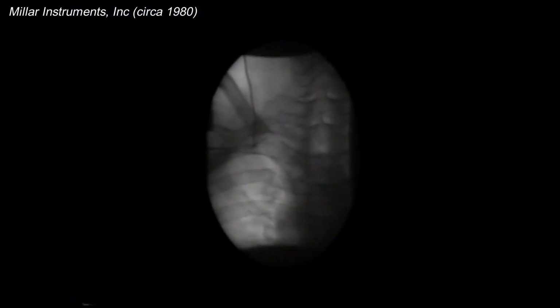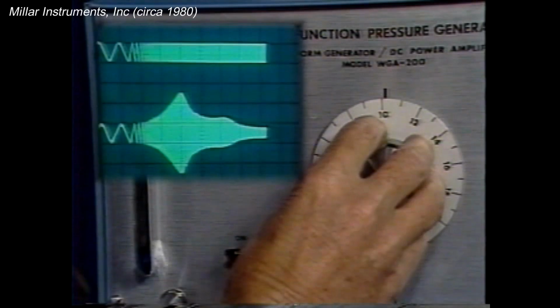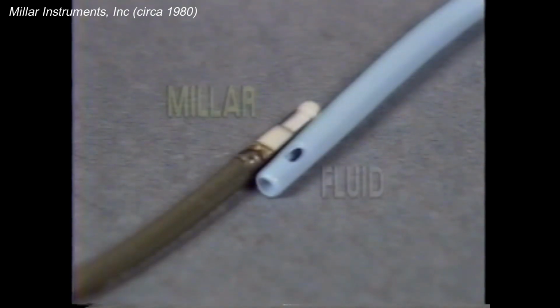Pressures in the body may be measured either through a fluid-filled catheter connected to an external transducer or with a transducer mounted at the tip of the catheter. Frequency response is an excellent indicator of how accurately each of these systems detects pressures in the cardiovascular system for reproduction by hemodynamic monitors. This demonstration intends to describe the differences between external transducer systems with fluid-filled catheters and Millar catheter-tip pressure transducers.